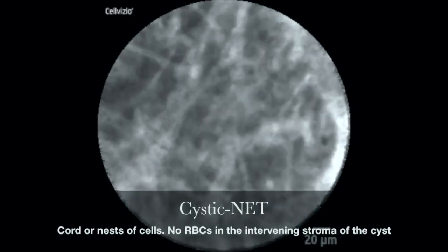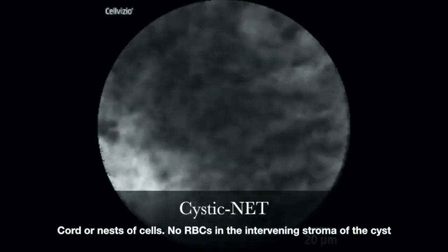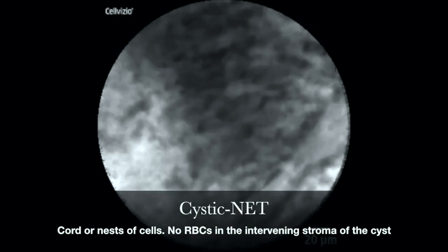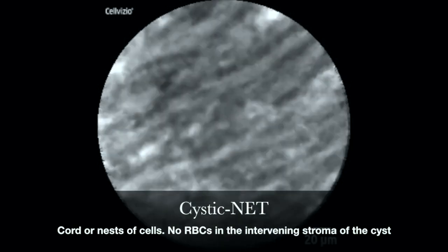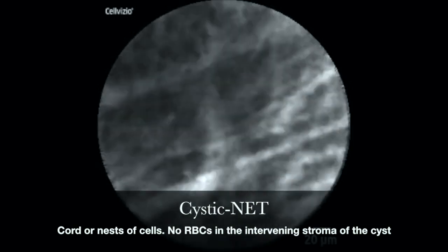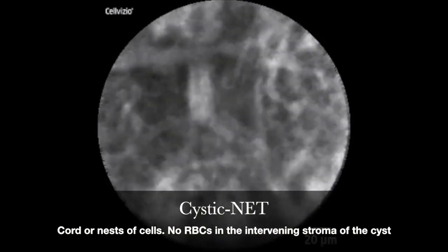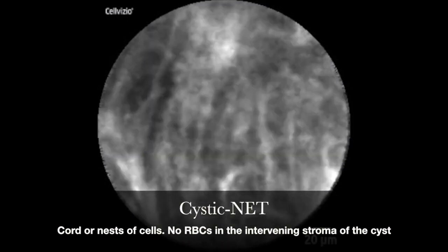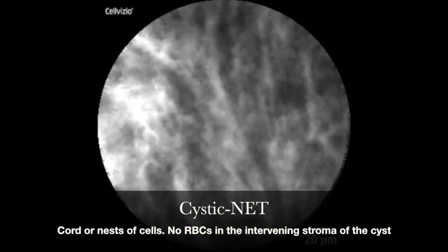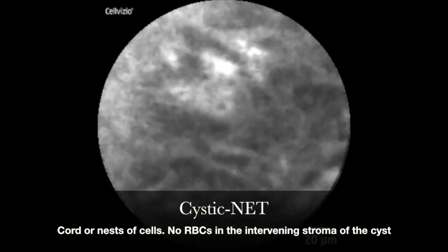Here is a video of the trabecular epithelial pattern of cystic neuroendocrine tumor or pseudopapillary neoplasm. You see groups and clusters, or sometimes cords of cells. These clusters are separated by the stroma of the cyst. Spaces between these clusters do not have any floating RBCs in them. The clusters and groups are in various shapes and sizes. The image pattern is produced because these two lesions are highly cellular compared to the other cystic lesions.